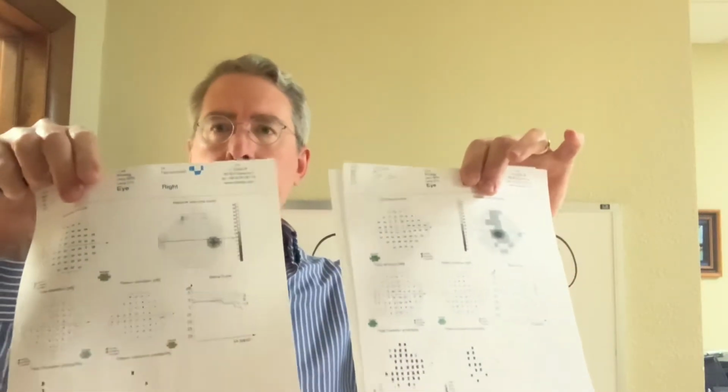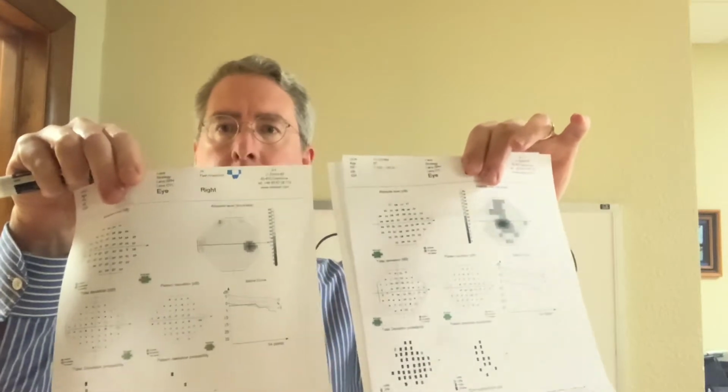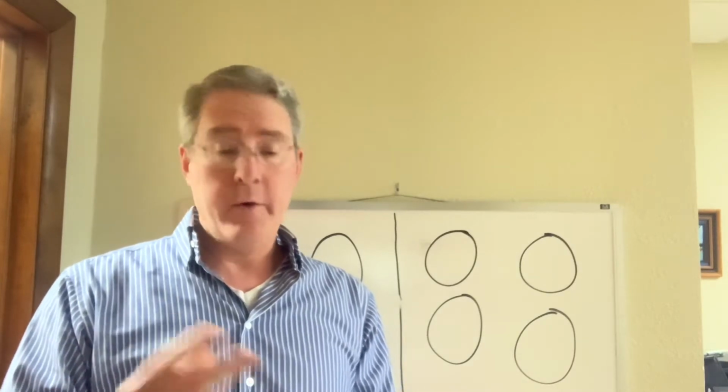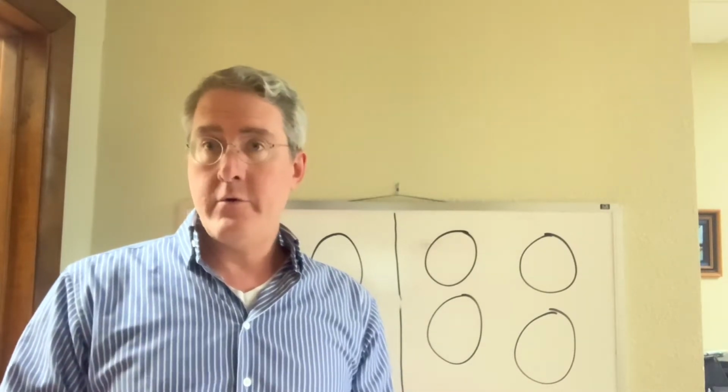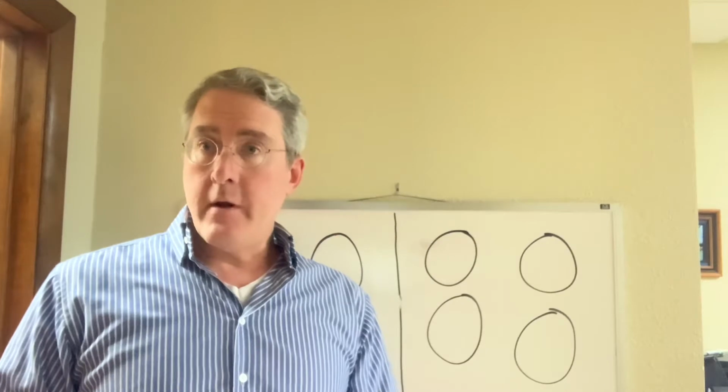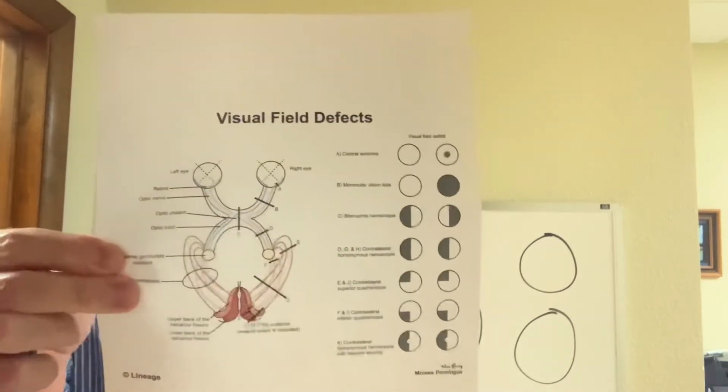As ophthalmologists, we spend all sorts of time worrying about the decibels and the patterns and the pattern deviation and all kinds of things like that, which, frankly, your average medical student or family practitioner doesn't care about. For the neurologists or the neurology textbooks, you get this sort of thing, which is nice.